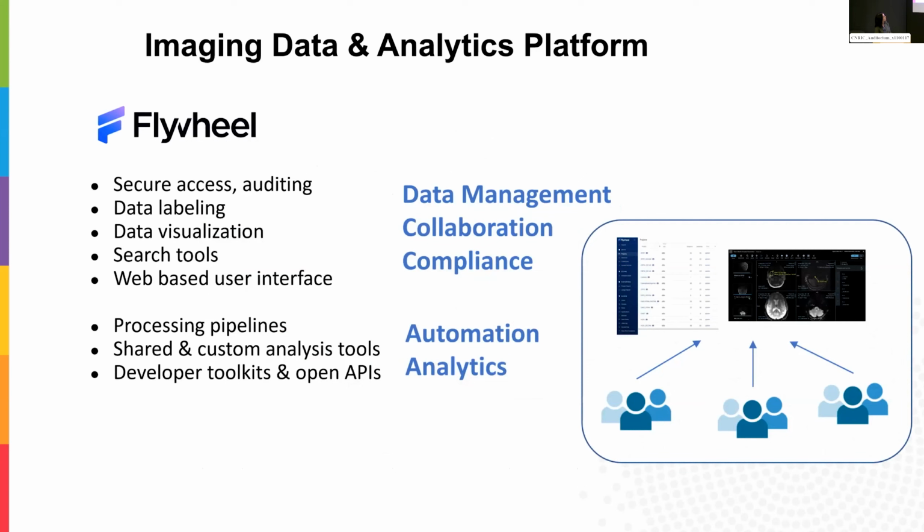So Flywheel has a lot of built-in ways to be able to handle cases like that. It allows secure access, auditing features. It has a built-in viewer, which I'll show you. There are query tools, automated classification of images, and also it allows built-in software that can either be shared between groups and community sourced, but it also allows people with programming knowledge to use their open Python toolkits and open REST APIs.